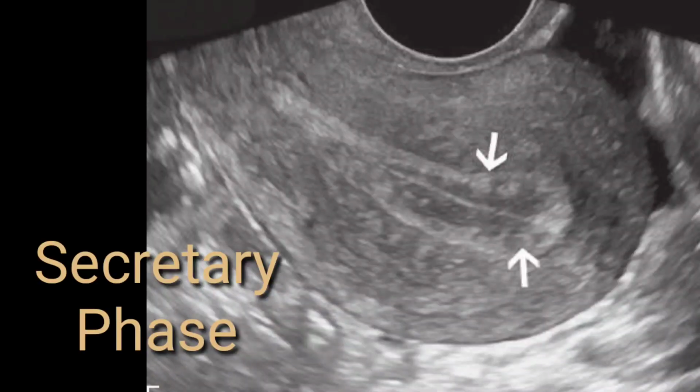Here on this transvaginal scan, the uterine position is actually retroverted. So retroversion is visible here. Endometrial lining you can well appreciate, and you can appreciate the central line as well. So you have to take the measurement from the center upward. Both arrows are indicating endometrial thickening, so you should not take the measurement from one end to another. You have to take the measurement from the center towards either upward or downward, and that could be the true measurement.